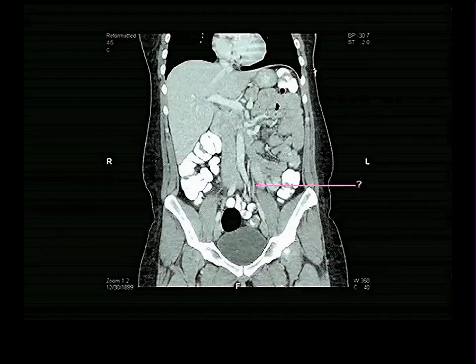The inferior mesenteric artery, or superior rectal, crosses the common iliac coming down. The ureter crosses the bifurcation of the common iliac coming down. The ovarian vessels cross the external iliac coming down. So they again cross the iliac vasculature from right to left. Inferior mesenteric crossing the common, ureter crossing the bifurcation of the common, ovarian crossing the external iliac.